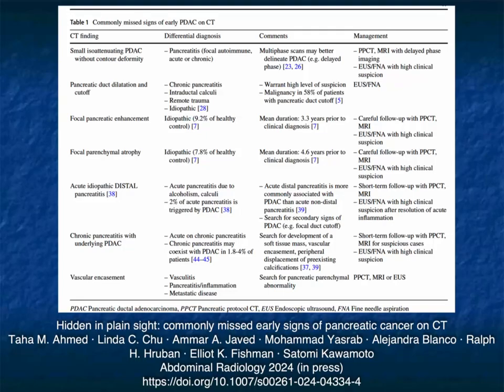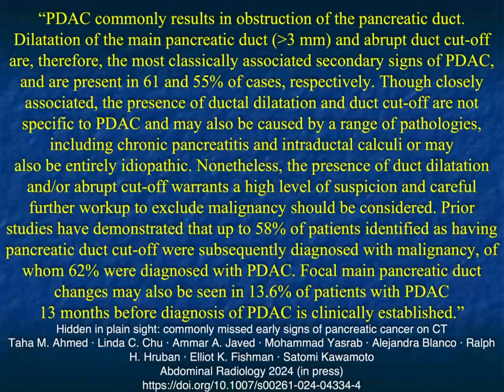Now, it's not always going to be from cancer. We can see that with vasculitis, IgG4, for example. We can see this with autoimmune pancreatitis. We can see it from other causes, from lymphoma to other malignancies. But again, you need to look carefully. If the vessels look abnormal, they're thickened, you've got to suggest the possibility of neoplasm, maybe suggest vasculitis, but the patient needs to be worked up. There's no doubt about it.